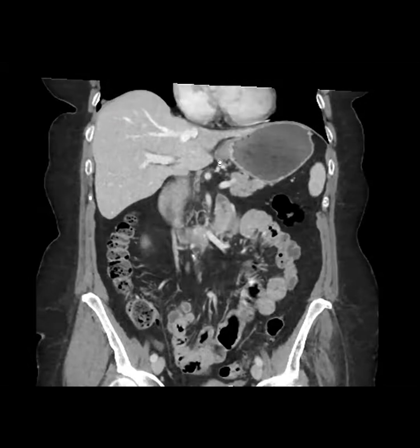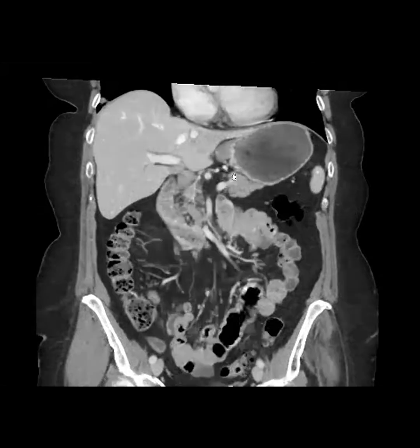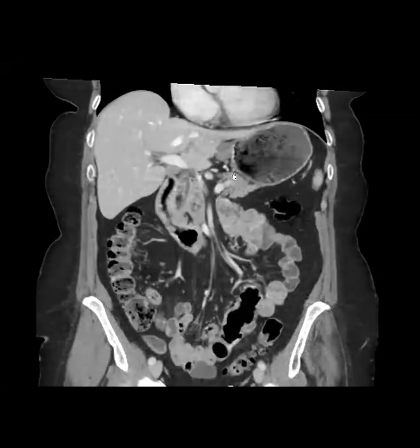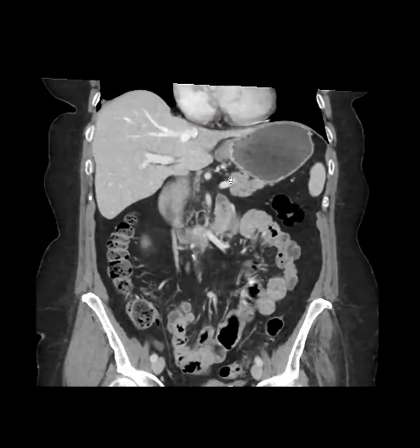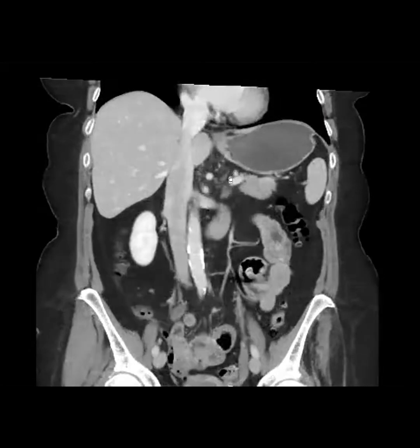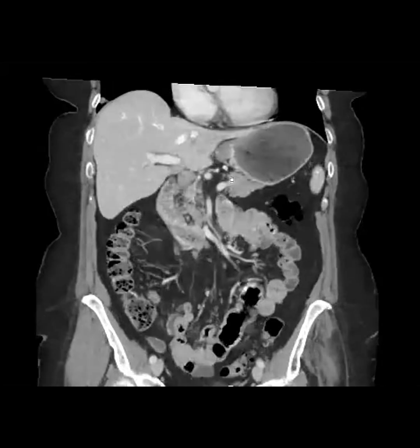And if I see something like this exophytic from the stomach, at least 9 out of 10 times it's going to be GIST. About 92% is GIST, 5 to 6% is schwannoma, and this turned out to be schwannoma. Cool. So that's the reason I'm showing it. I think we can't really tell on imaging. Have to biopsy.